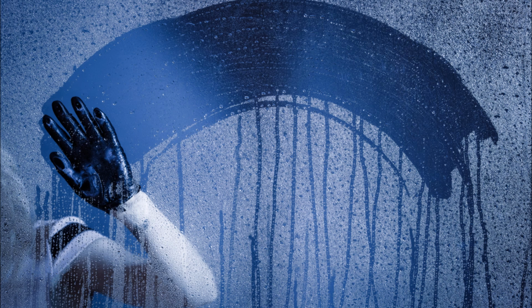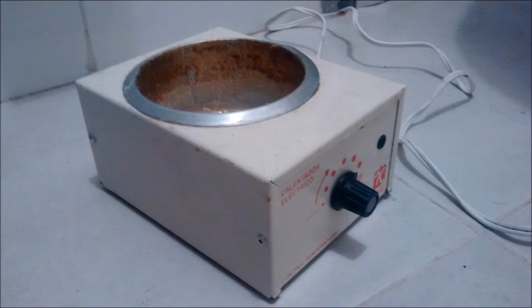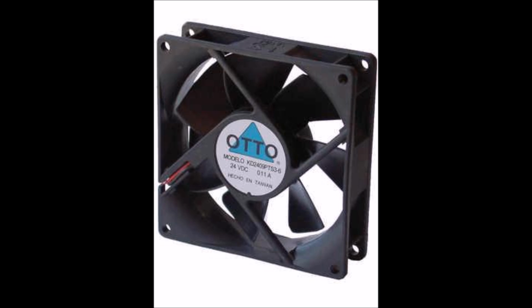Monitoring. The principal performance of the incubator was based on three principal components. First, the humidity generator. It was based on an electric heater with a container. This container had to heat water and generate the steam needed. Second, the heat generator. It was based on a resistance and a ventilator. When the resistance was hot, the ventilator was at maximum power to push up the hot air.